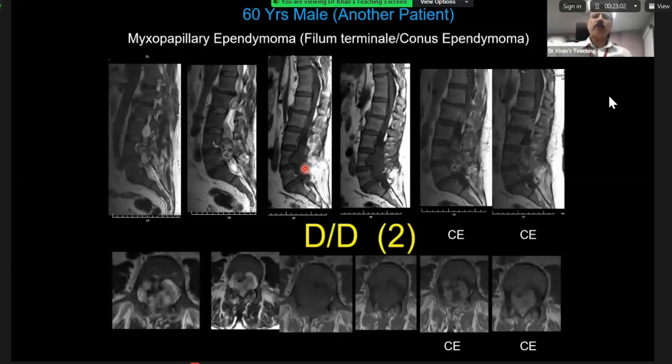They are long-standing. One of the key findings visible here on this T2 weighted sequence is that there will be hemosiderin deposits, which is chronic blood, which will be low signal on T2. But look what is happening, because it's sitting there for ages. It is doing posterior scalloping. Now look at these axials, and this will tell you what happens. It is sitting within the spinal canal, and it is causing this. You can see that this pedicle is thinned out.